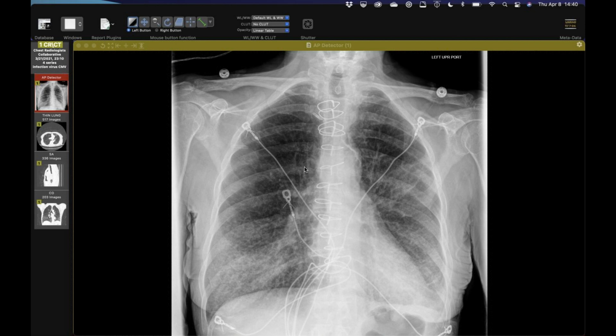Okay, so this is just a nice example of something we don't always pin down a diagnosis on. So this is a heart transplant recipient, and you can see hearts there, and there's clearly abnormal looking lungs. A bunch of opacity in both lungs, and it has sort of a nodular consistency to it. We don't really see much in the way of pleural disease, and it's sort of basal predominant.